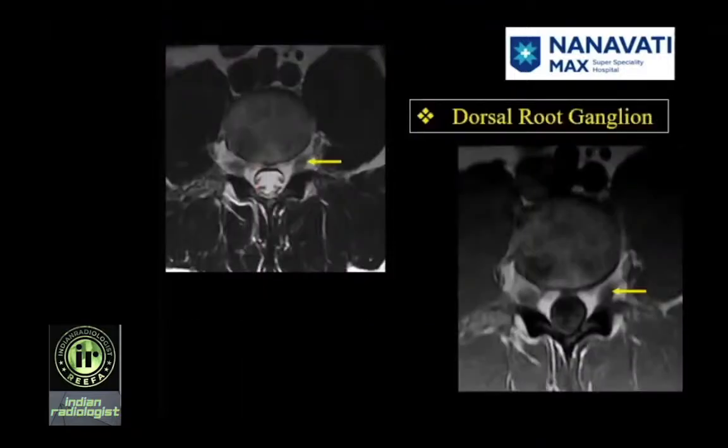A little bit about dorsal root ganglion. As the nerves exit at the foraminal level, you get slightly swollen appearance of those exiting nerve roots. So these are not really swollen nerve roots, but these are dorsal nerve root ganglia. They can be as small as this, they can be as thick or big as this, and this should not be mistaken for sequestered disc fragment.